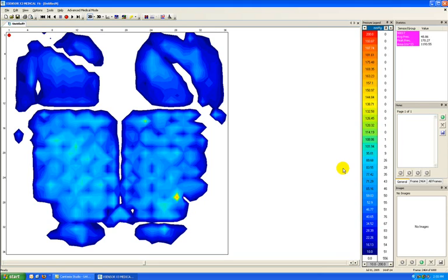The next thing we need to pay attention to is the pressure legend. At the bottom of this pressure legend, it tells me that I have a pressure range on this sensor of 10 to 200 millimeters of mercury. So I'll see the extent from 0 up to 200 millimeters of mercury on the pressure legend, with 200 millimeters of mercury representing red values on my pressure image, and lower pressures representing green or blue values.